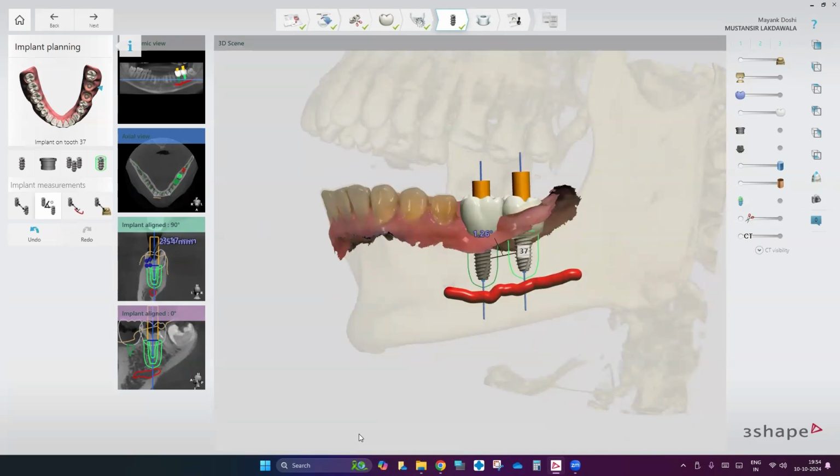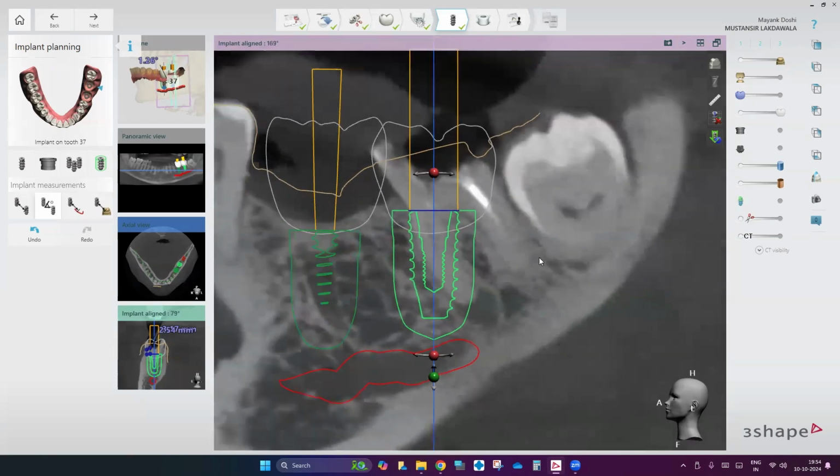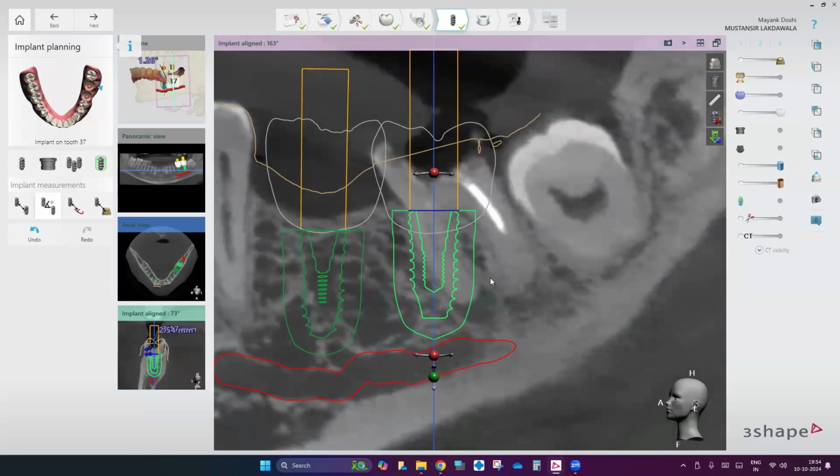Yes. So, for example, we will never ever, which in earlier times as implantologists, this is what we used to do. We used to follow the tooth. So, if this tooth was like this, you see how off I am to this tooth. And our earlier philosophies were to drill in the center like this into the furcation. Are you guys getting what I'm trying to say?